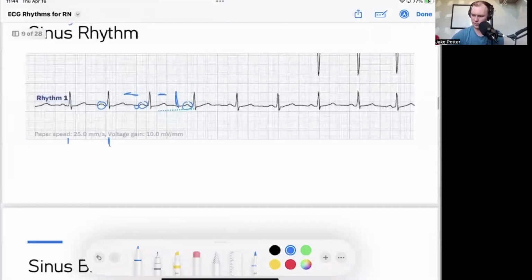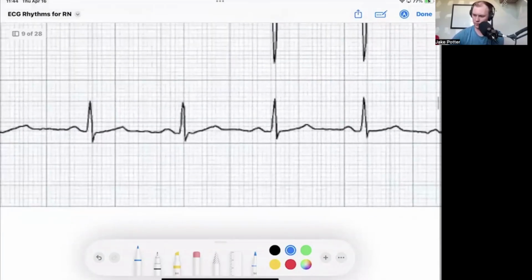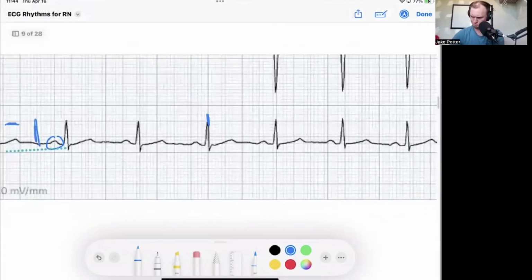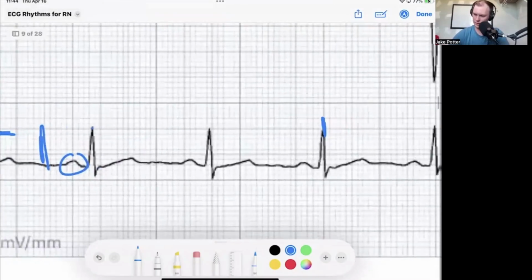And this is going to be a rate. We'll break it down here. Try to start with a big line. So right here, we see big boxes. These ones are kind of more difficult to see. This diagram's not as clear on the big boxes.